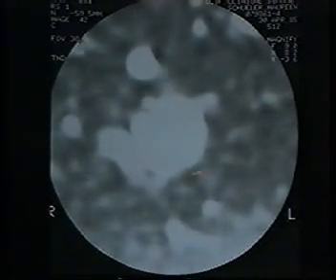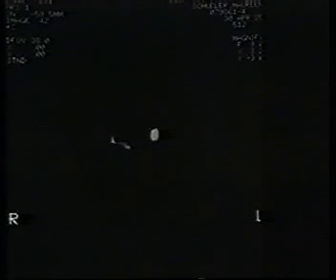Well, this is a blown-up look at the patient's nodule, and this is a blown-up look at those dense pixels. These do not constitute 10% of the size of the nodule, and if you look at the position of these dense pixels, they are not central but sort of peripheral within the nodule. This cannot be called a benign lesion on that basis, despite the presence of some calcification, and this is a metastasis.